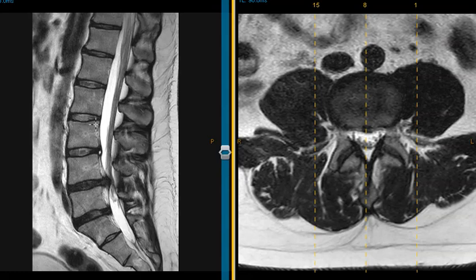And in this view, we see him in profile. This is the lumbar spine. Here's L1, 2, 3, 4, 5. So here's the lowest lumbar vertebral body. This is the sacrum here. We can see the squares of the hard bones, vertebral bodies. In between, we have these soft discs. These are the shock absorbers or the cushions that keep the bones from rubbing together.